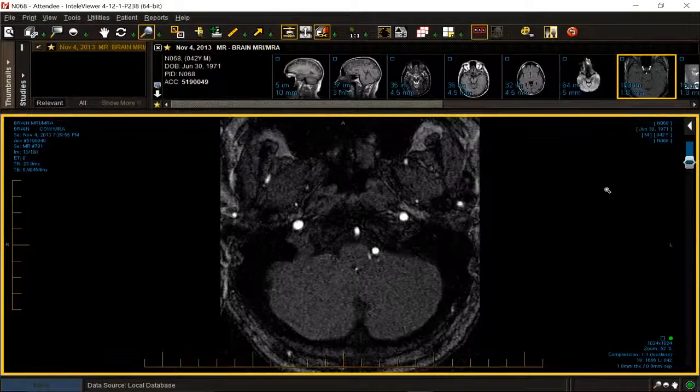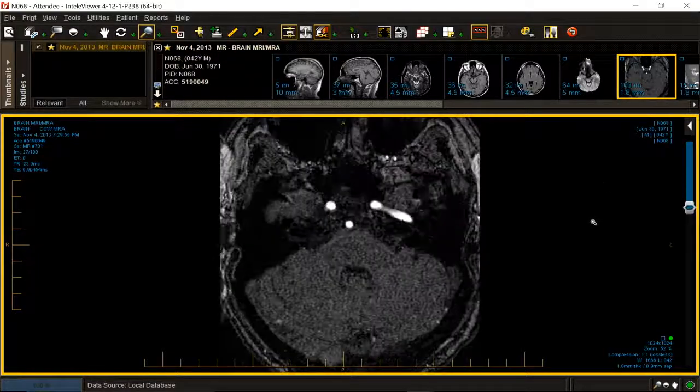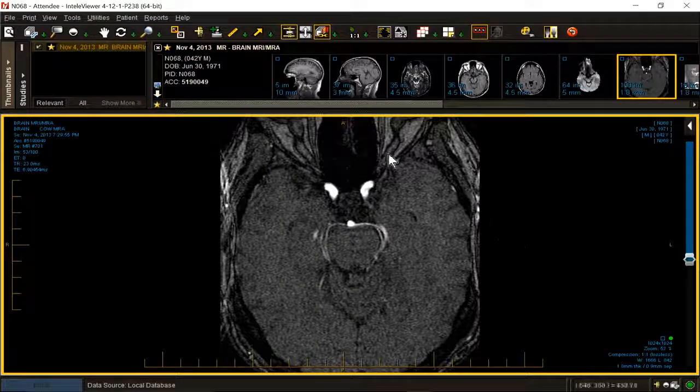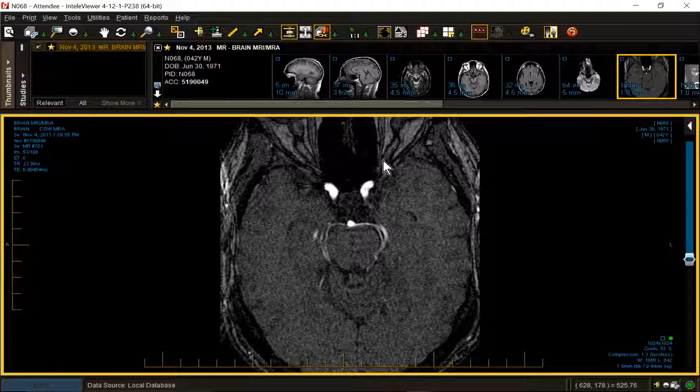The history is occipital neuralgia, pain in the right anterior face for 6 months, retroorbital pain, ear pain. So multiple territories. As stated, the raw data of the MRA, not the MIP MRA, is the most valuable contribution to the diagnosis of a vascular compressive loop syndrome.